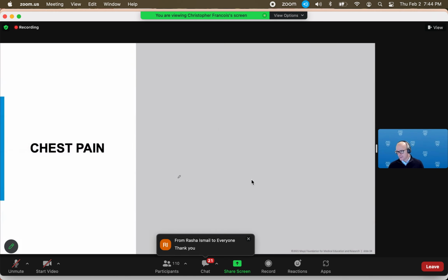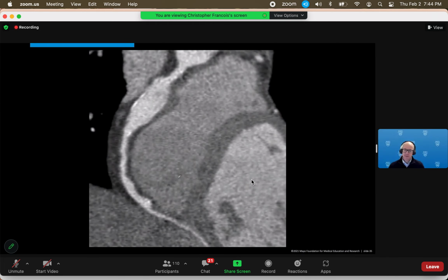Okay, next case. All right, we've got Ufara Suwasti. So this is RCA. Correct.